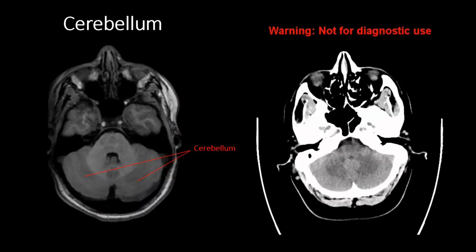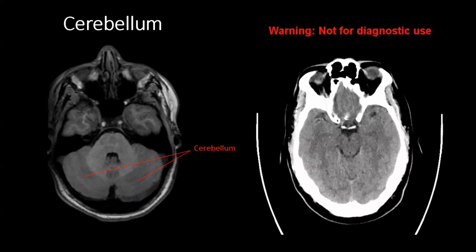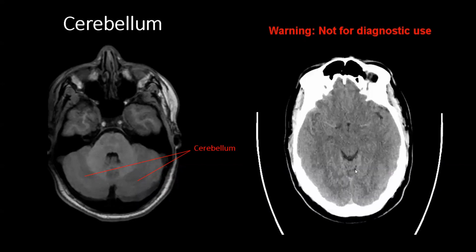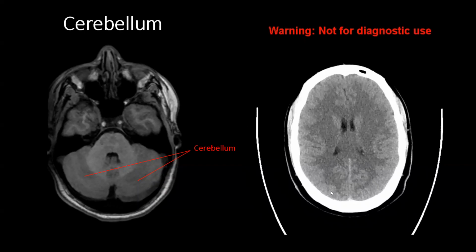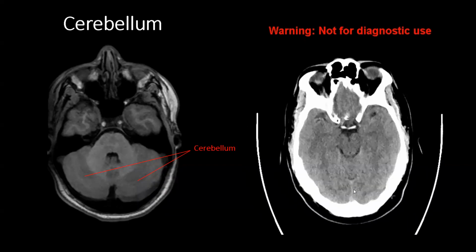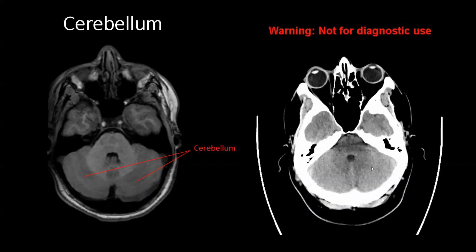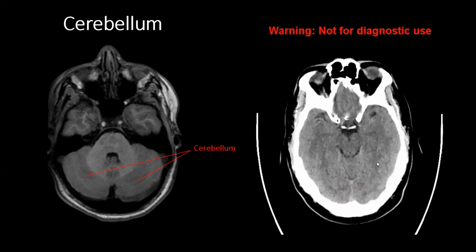Another important intra-axial or brain tissue structure that we have is your cerebellum, and that occupies most of the posterior fossa at the posterior inferior aspect of the cranial vault. And you can see your two cerebellar hemispheres here. As we scroll through, you move from the structures we were just talking about, the occipital lobes, downwards into the cerebellar hemispheres here. In this posterior fossa, in this same slice, you can see a few other structures, which we'll talk about shortly, the pons and the fourth ventricle.